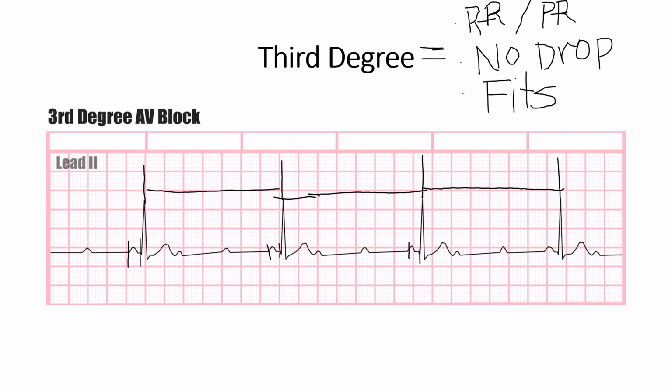Oh, that was a bad point, you see there, because I went behind the deflection point, but you guys get it. Even if I went before it, coming up a little bit closer, this thing fits. So right there is where it should be. And here is where we should measure again. And then right here at the cutoff, that all fit, and that's okay.